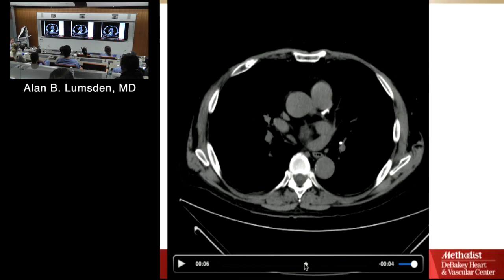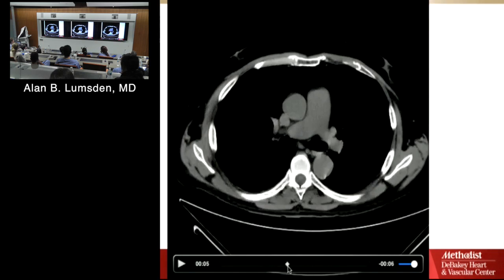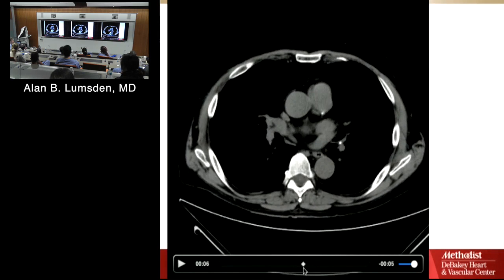Well, it's similar density to the descending aorta, except it's got these black dots in the middle. Is it the base or the apex of the heart? Nope. Black dots are what? Air. Okay, so watch this. Watch that structure. It goes up there, comes down here, still there, although it's hard to see. So this is an air-filled structure adjacent to the aorta that runs alongside the aorta and is immediately anterior and to the right of the aorta.